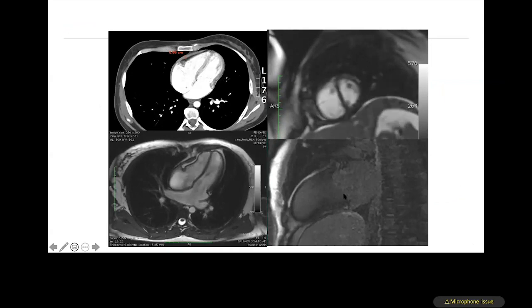In addition, this is a CT scan of the same patient. The patient has a very thickened pericardial layer over the right ventricle, and there is evidence of some inflammatory state. This is delayed gadolinium enhancement. All of this information is very important. This patient was found to have an inflammatory state, and therefore an initial attempt was made to see whether the patient would respond to anti-inflammatory medications.